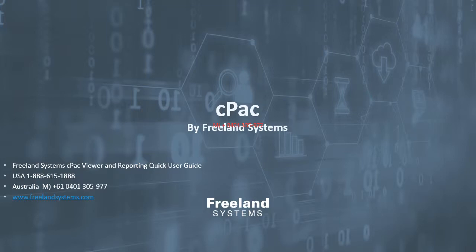Welcome to Freeland Systems cPac Viewer and Reporting Quick User Guide.